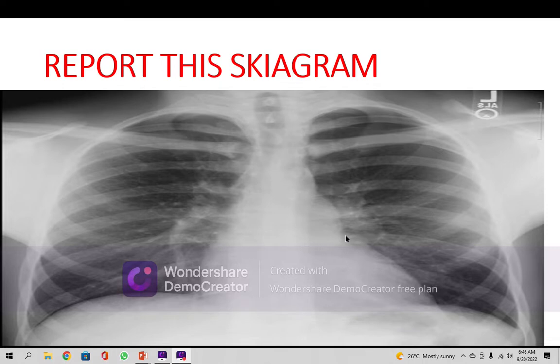Inshallah, we will meet again in the next plain X-ray chest with some clinical profile and some investigations added. So the case discussion is going on under the umbrella of this plain chest X-ray PA view. Inshallah ta'ala, afterwards I will talk about the next X-ray.